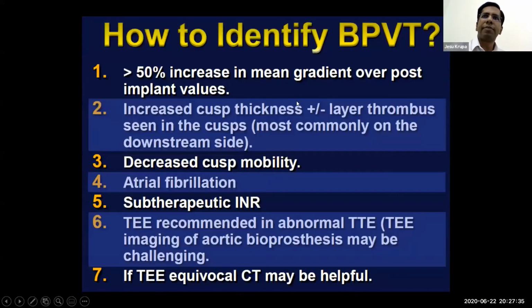So how to identify bioprosthetic valve thrombosis, BPVT? It's extremely important to carefully monitor the gradients over time. So this is extremely important. We should not disregard any minor increase in gradient also. If we don't have a satisfactory explanation, then these patients should be under careful and close follow-up. So that is something to know about bioprosthetic valves. That is the point I'm trying to make by showing these examples.